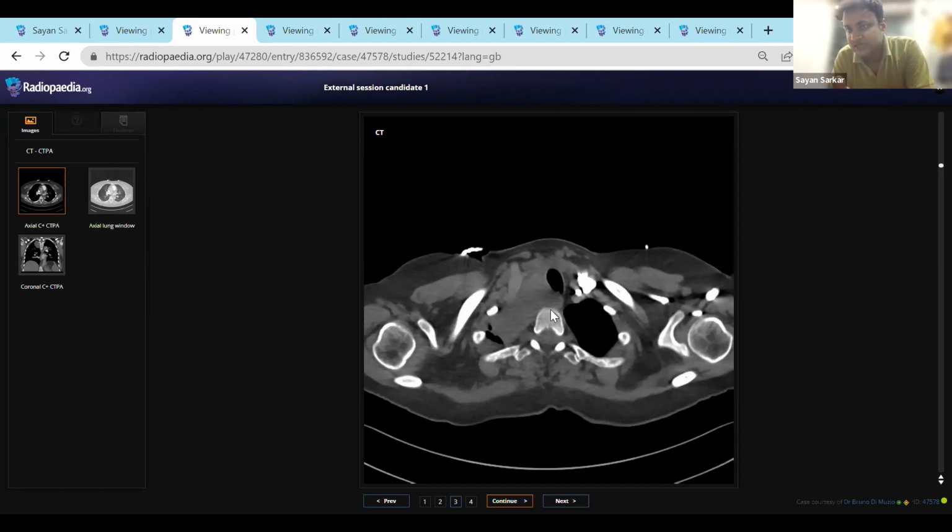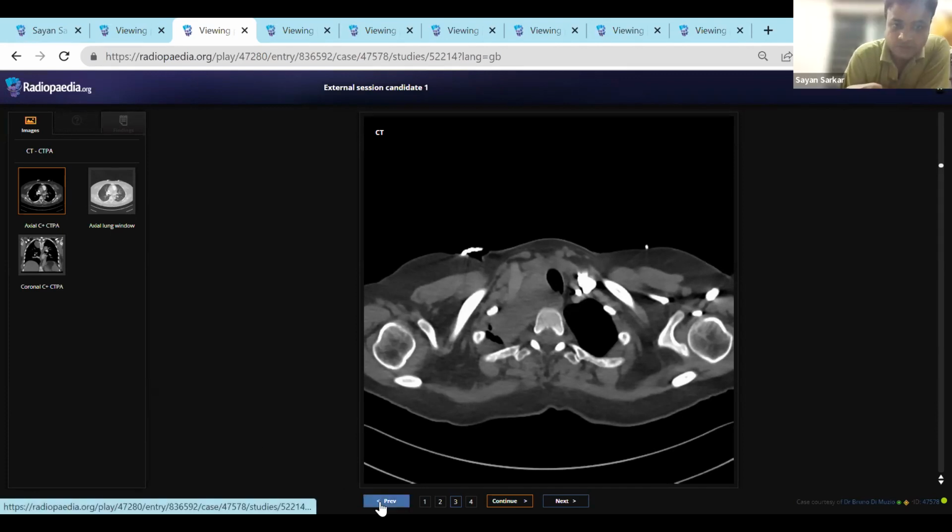You can just say it's a TIRADS 2 lesion. So you have to use these things like TIRADS or BIRADS, whatever. Though those are the American guidelines, you can still use TIRADS, and it's a TIRADS 2. Anything which is TIRADS 2 does not need sampling normally. Okay, and even if you're suspicious, you can do an FNAC.